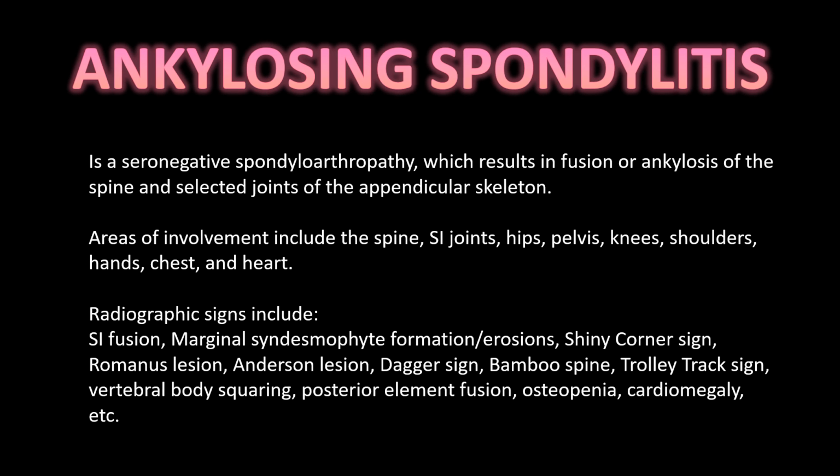And this patient had a confirmed diagnosis of ankylosing spondylitis. And this is a seronegative spondyloarthropathy, which can cause fusion of all different areas of the spine and selected joints of the appendicular skeleton. It can also affect different areas like the chest and heart.